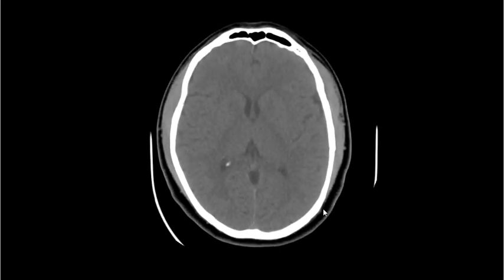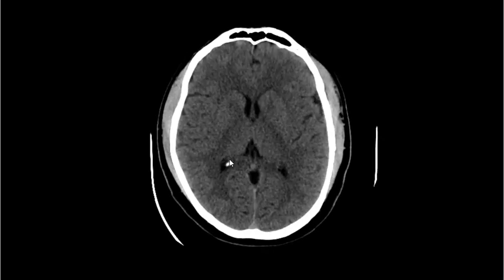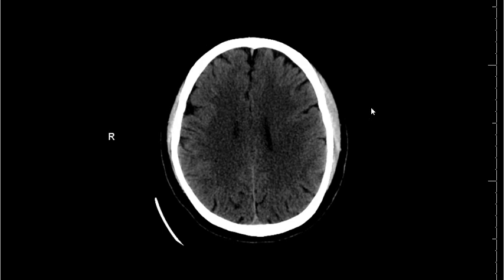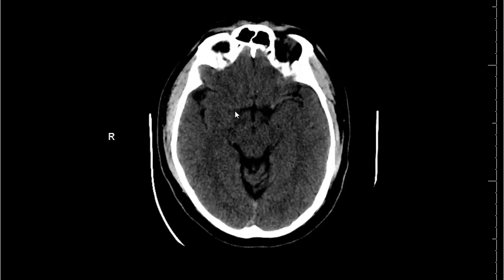I like to start with the parenchymal window, or as we said, the stroke window. So you change the window to your preference until you see a very nice gray-white matter differentiation. See the thalami, the basal ganglia separate from the white matter, whether the corpus callosum or in this case the posterior limb of the internal capsule. You can see this gray-white matter differentiation at every level. Now if you look carefully, the margins adjacent to the bone are blurry. We don't see them very well. As we said, on this window we can evaluate the ventricles, the gray-white matter. We can evaluate the vessels if we have the setting of stroke and we're looking for a dense MCA sign.